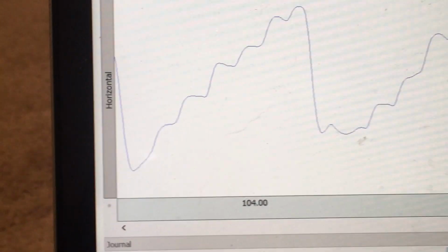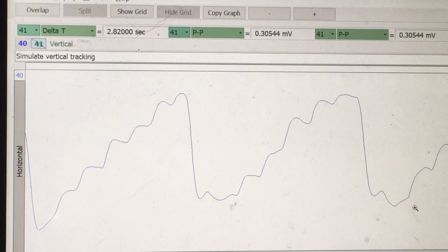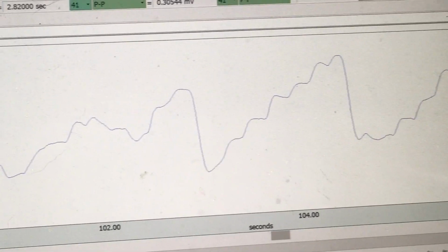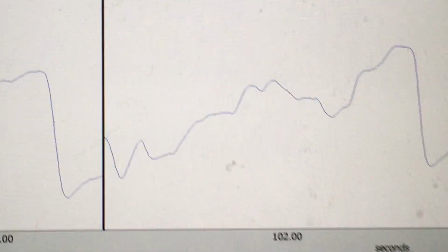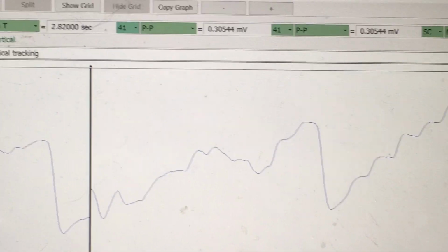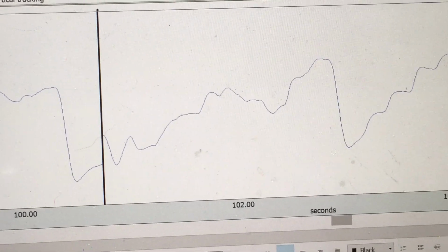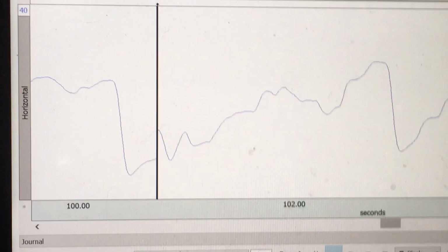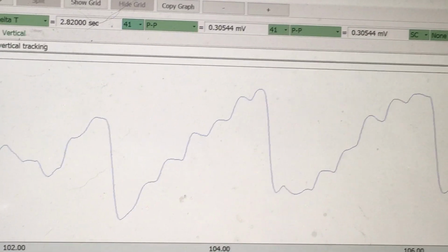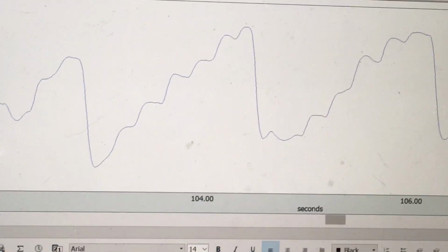We have to find, first of all, 2 lines of text that he's reading. And I'm going to kind of lay it out. You don't want to start here because that looks very hard to figure out what's going on, and it doesn't really follow our rule of thumb, which is to find something that has a repeating pattern. These next two look as good as we can get in that realm.